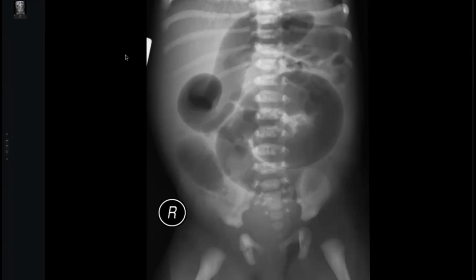I know that it is difficult to differentiate between small and large bowel within the pediatric age group. So we call it upper and lower GI. Okay, so it is better to describe upper or lower GI, and don't mention either this is colon or it is jejunum, because it is very difficult. Yes, go on.